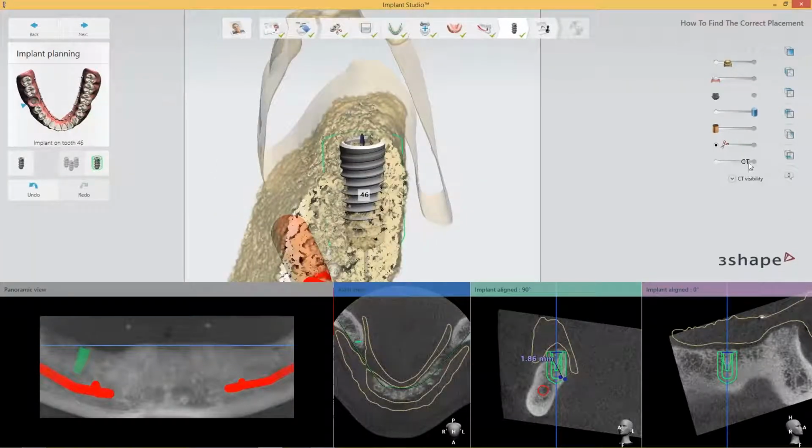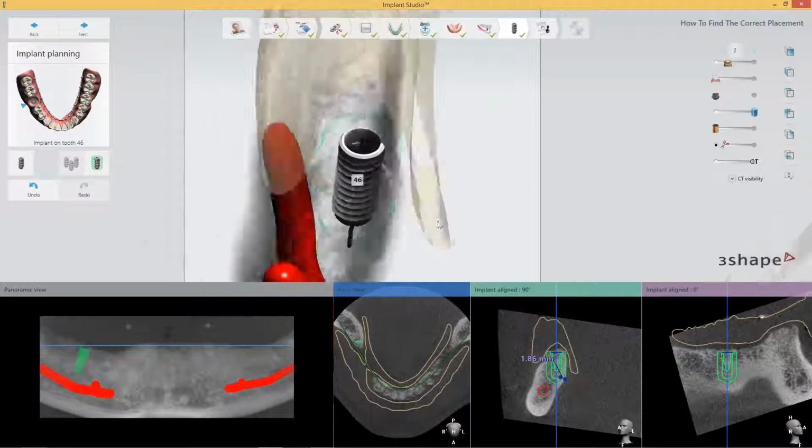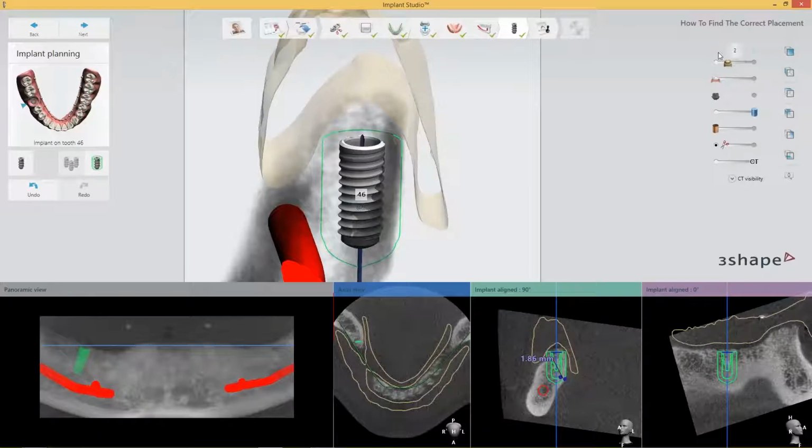Yeah, and depending on your settings, of course, for the CT quality, you can even work in a normal X-ray mode if you like that. So you can see the bone as it is. Here with our tools, you can change the blackness and the contrast and so on for the X-rays as well. But this is a nice way to watch and view the implants.